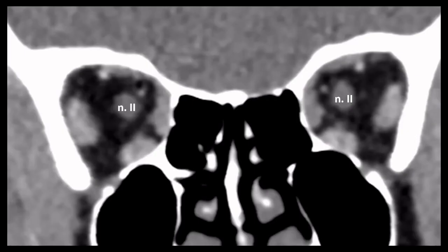The intraconal compartment consists of more than just the optic nerve. It also contains fat, certain blood vessels, and also certain cranial nerves. And the cranial nerves are more difficult to see. The most important ones would be the superior and the inferior branch of the oculomotor nerve. And of the vascular structures, we can on most images clearly see the ophthalmic artery located here, superomedially of the optic nerve. And the ophthalmic artery remains in the vicinity of the optic nerve because it enters the orbit through the optic canal along with the optic nerve.